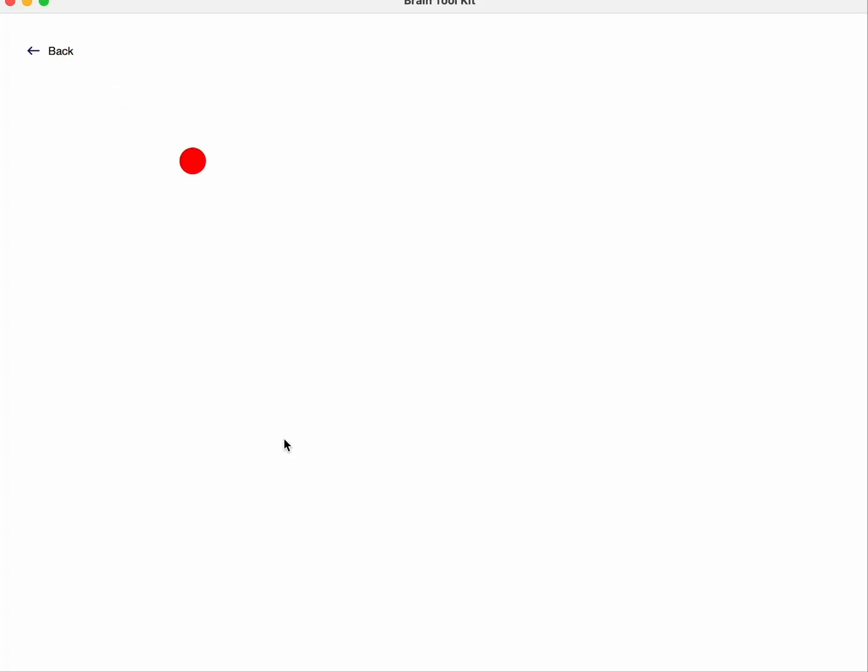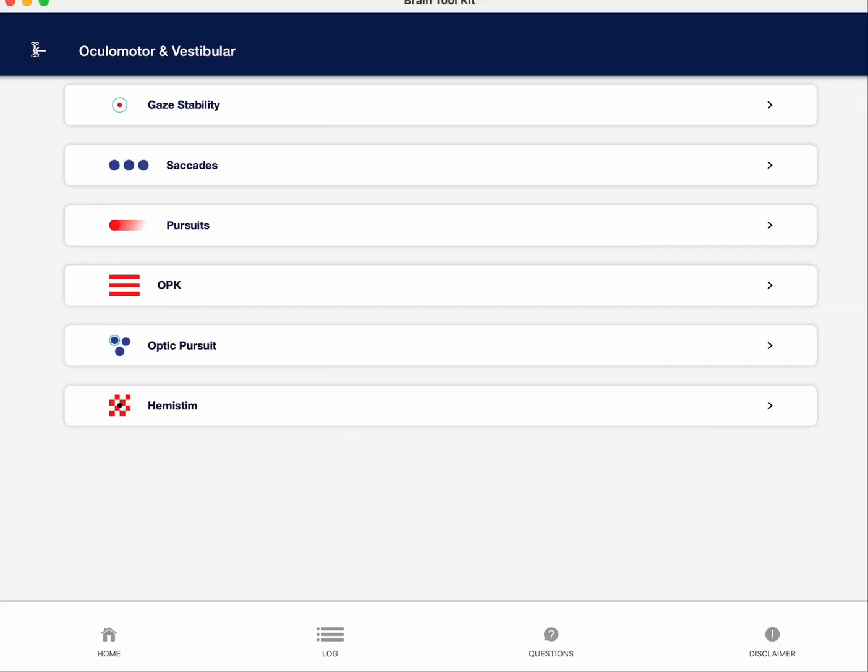Now, of course, you can use this for assessment also, and then you'll be looking at accuracy. You want to look at things like eye fatigue. Is there excess blinking, watering of the eyes, clear strain on the eye tissues? You can also monitor heart rate and see if there's an increase in heart rate with the activity, which would indicate that there is stress to the system while doing the activity. And of course, you can do that with all the activities.